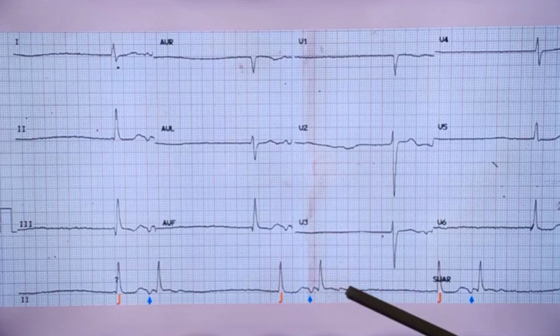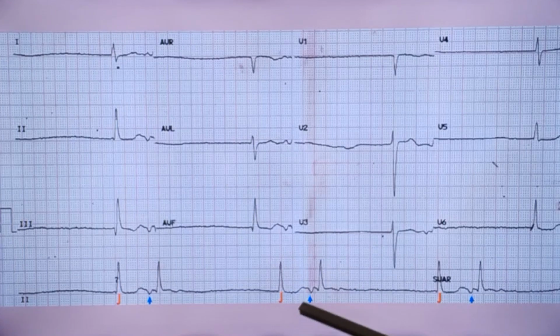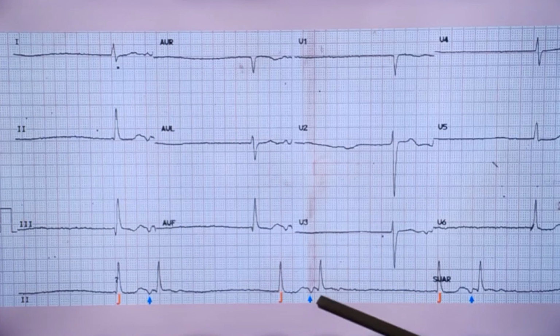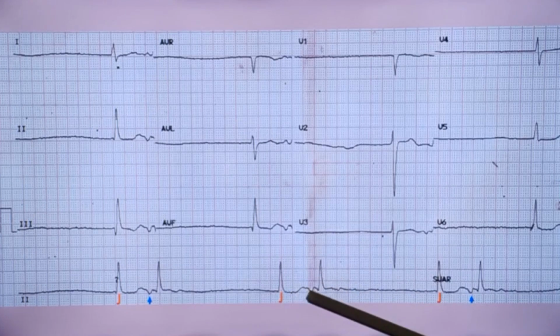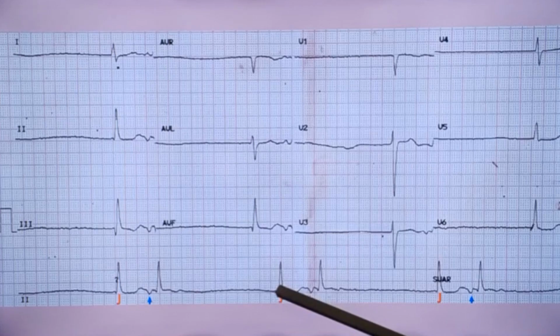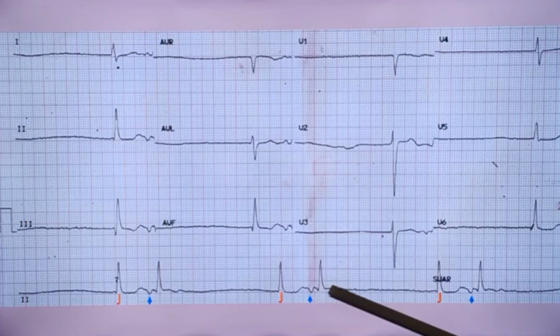And this is not a junctional ectopic beat. In the case of a junctional ectopic, that should be premature. It should come before the expected sinus activity. Here it is not that. Sinus is not there, so the junction is escaping. And this is an echo beat, a junction-atrial echo beat into the ventricle. So overall, this qualifies for a rare diagnosis of escape echo bigeminy.